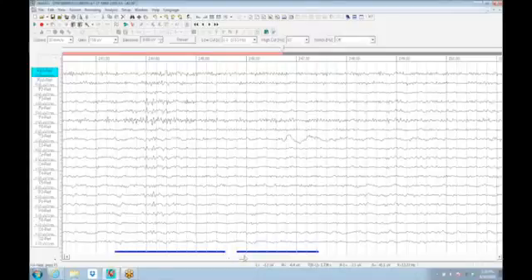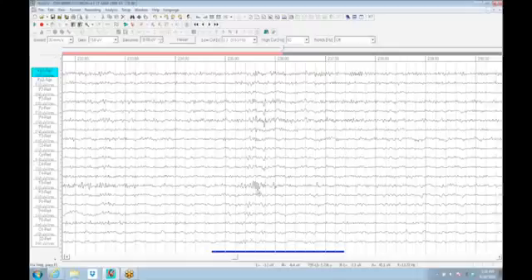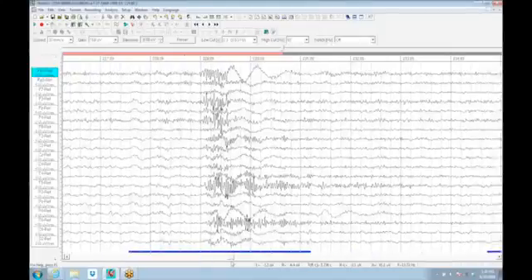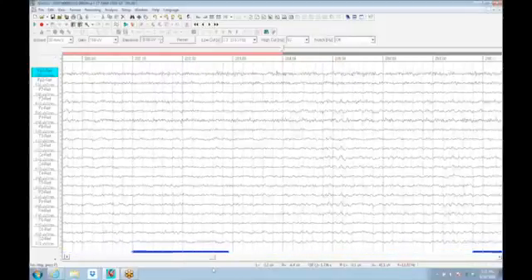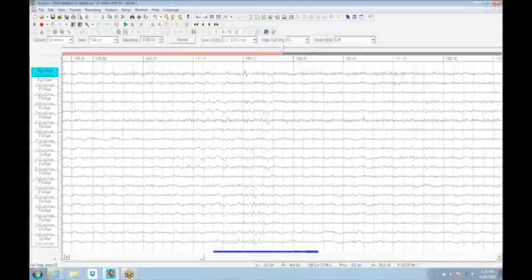But you can see the destruction of the EEG. Now we'd want to pull some of this out because of the muscle. And here's another piece we would have wanted to throw out, and it will be thrown out. But there's lots of it here that we would have allowed very nicely as valid, clean pieces of the EEG.